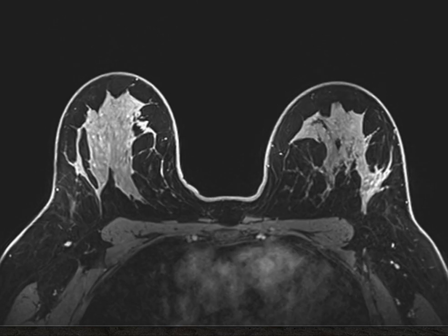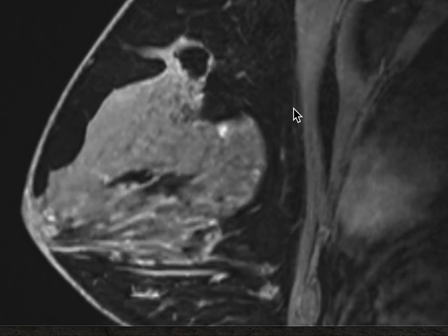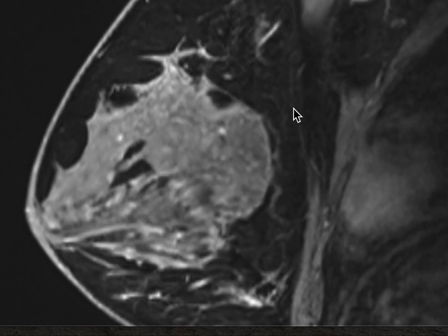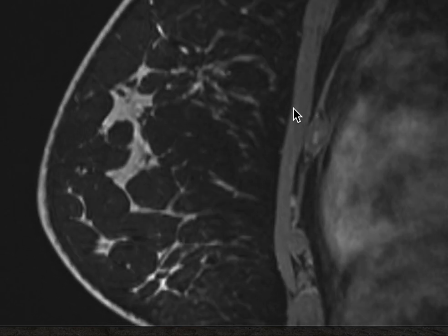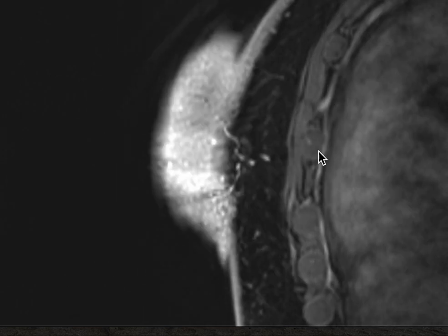Okay, and then after that, I look at the sagittal. We do sagittal post-contrast fat sat. I'm not showing the whole field of view, but I go from one side to the other. So I look at the breast, I look at the internal mammaries, I look at the axilla, and then I look posteriorly at everything else. If you have, especially someone with cancer staging, and this one is just high risk, this is the internal mammary area.